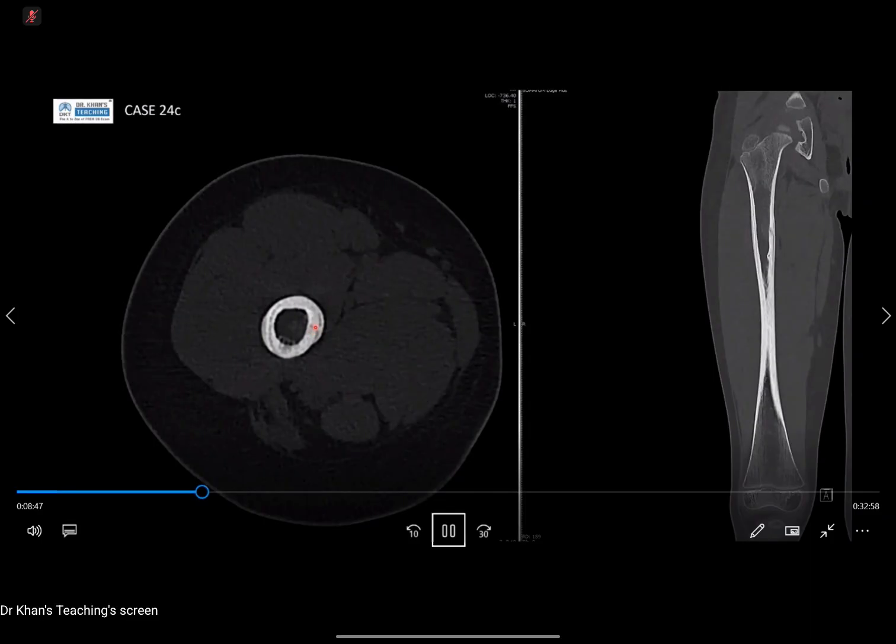You're thinking it's a tract, but if I say it was osteomyelitis, then you'd be expecting a bit more sclerosis and certainly some soft tissue changes, which we're not really seeing that florid on the MR. Also, thinking of osteomyelitis, yes, I did say it was periosteal location, but often it will move somewhere. It often starts in the metaphyses, then goes subperiosteal. I think that's the more common distribution than subperiosteal going inwards.